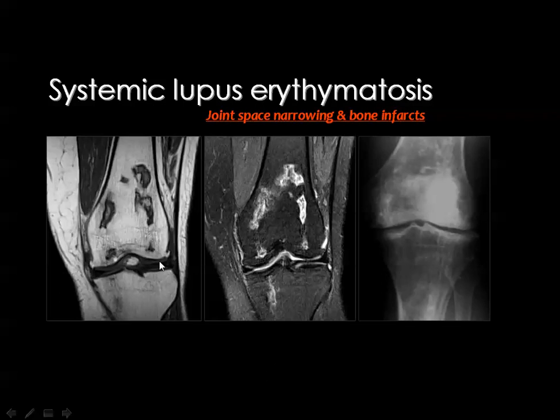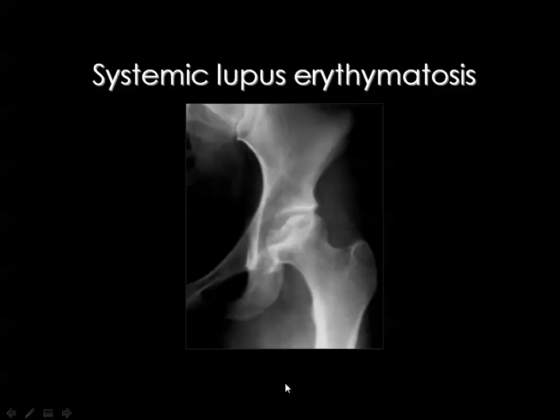They occur in the medullary cavity of long bones. They are similar to Chinese figures, and they have low signal in T1, high signal in T2, and may be surrounded by a dark rim from outside, but this appearance is almost very classic for avascular necrosis or bone infarctions.